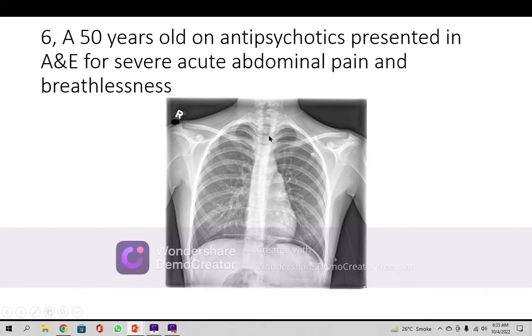So he engulfed most of the scalp hair or the beard hair. And here it is present, the whole appearance. This is called trichobezoar. Trichobezoar means that he has engulfed hairs here, and it causes inflammation and perforation there. So this is the trichobezoar.